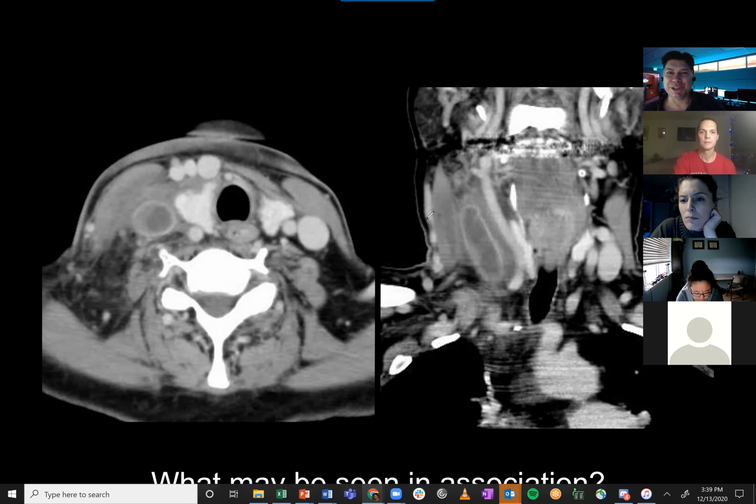If somebody had put in an internal jugular vein line and they just took it out, that guy would clot off his jug or something like that. So you have changes around it. So it's more than just thrombosis. This is internal jugular vein thrombophlebitis. We have a lot of infectious inflammatory changes that are kind of around it. That's right. Good job.